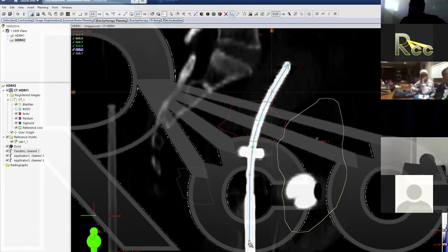That's right. So I'm going to go ahead, and here we like to always digitize well past where we're going to add sources. I'm simply running along the middle of that hyperintense area because we know now from looking at the other planes, the axial plane, the coronal plane, that we are right in the middle of the tandem. So we're never going to load past the flange, but we will digitize past the flange.